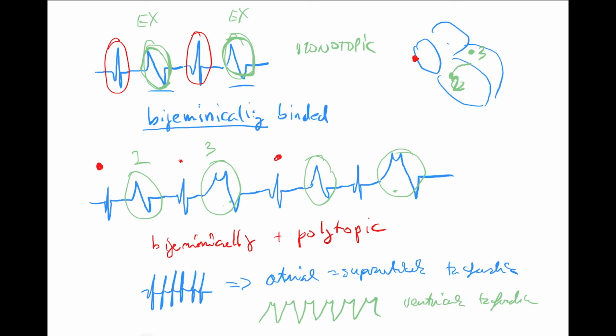That's why those are so dangerous, because again, perfusion decreases, you're having heart attack or you have a syncope and something happens. Okay, so V-tachs are very dangerous, and we're heading to ventricles now. So we finished the extrasystoles, atrial versus ventricular, and now we're getting to ventricles. And exactly what we're going to start with? Well, we're going to start with ventricular tachycardia.